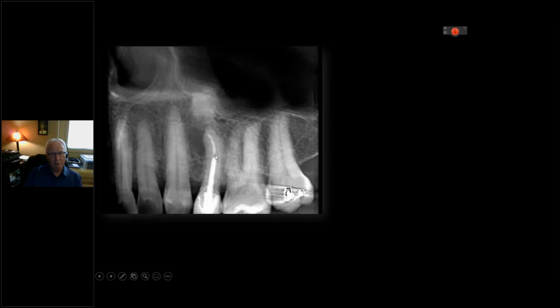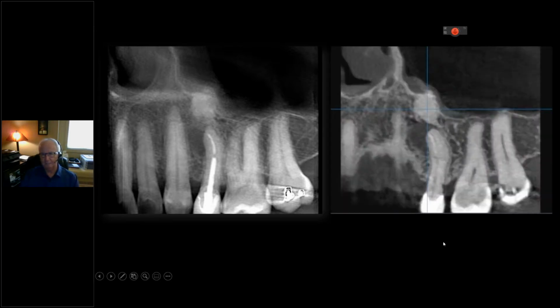This case, there was a post, very nicely done. The root canal looks like it was finished quite well. You can see a radiolucency beside the tooth and an area of probably dense bone island or osteosclerosis above it. As we were going through the case, I did see what I thought was a horizontal fracture near the apical third of this tooth, and of course that would be just about where the post would terminate. So that's a good place for a fracture if it's weakened.